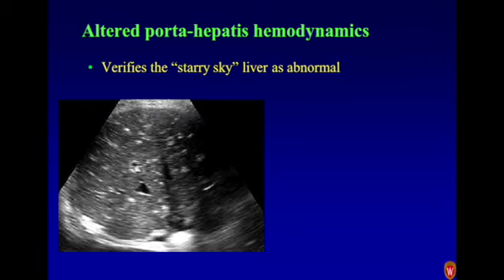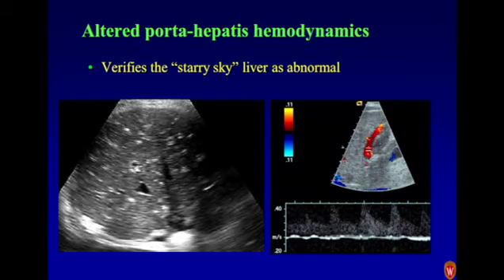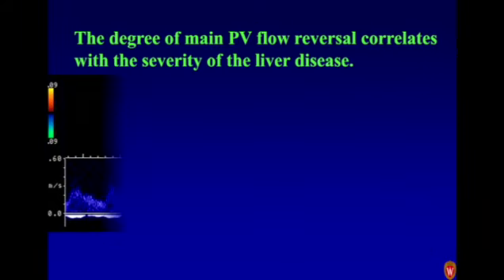And so what do we do with this? Do we talk about it or do we ignore it? I would encourage you in a patient like this to get that liver vascular index, because if it is altered, if the portal vein flow is down, hepatic arterial flow is up, there's something going on and it deserves to be mentioned. And maybe this patient needs to see a hepatologist. Maybe they need a better history. Maybe we need to find out what's going on.